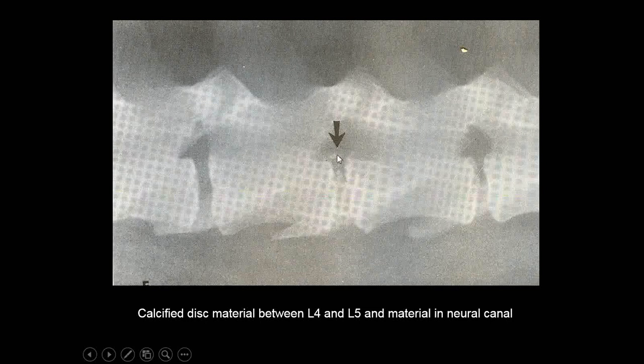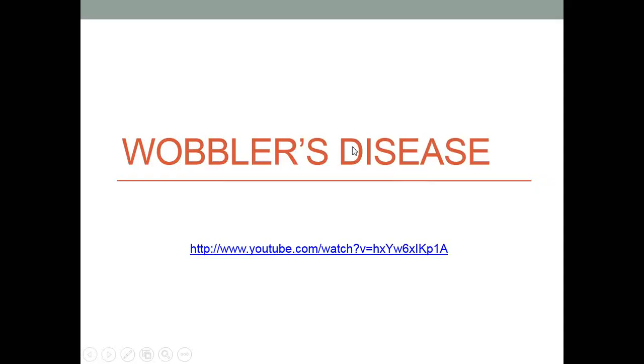Okay, and see this calcified disc material. You're not going to get that out chiropractically. We're going to talk to you about treating these guys, helping these guys out, doing traction on these dogs, adjusting these dogs. There's ways to treat this.